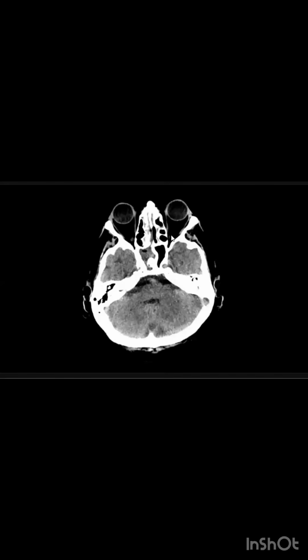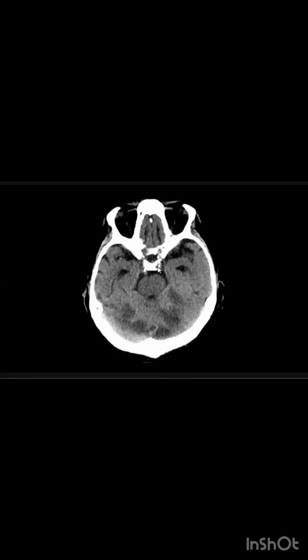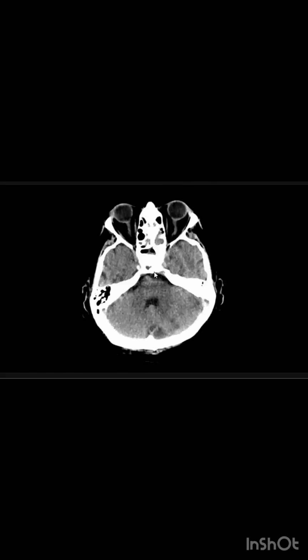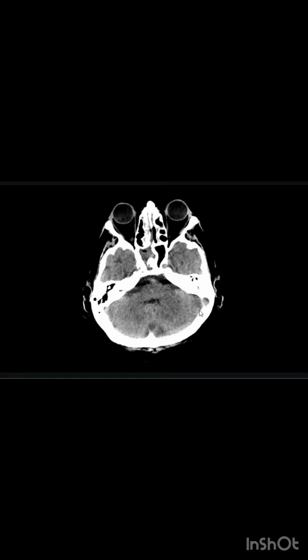In every patient, you have to look at the orbits, the sphenoid sinuses and the maxillary sinuses. You have to look at the vessels, the optic nerve, the superior ophthalmic veins. All this you have to look at, and the foramen magnum. You did it at the end, but you took more time to reach the stress area on the left mastoid.